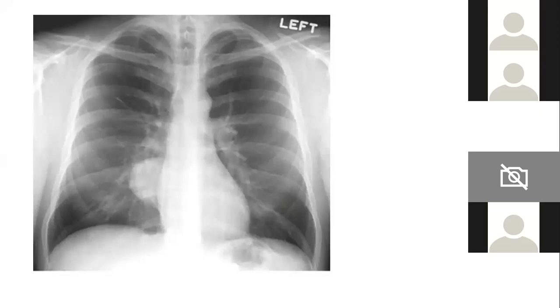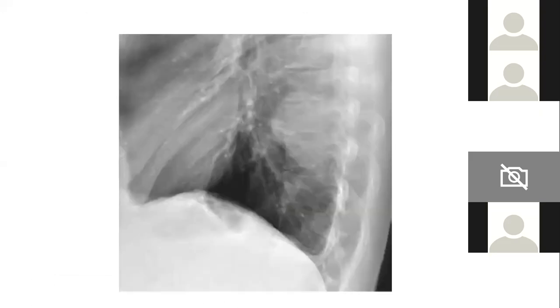I would say it is still a possibility in this case, middle or posterior. So every time we will not be able to exactly localize. This is an example of that, right? This can be either in the middle or the posterior mediastinum. This was in the posterior mediastinum, as rightly pointed out by many.